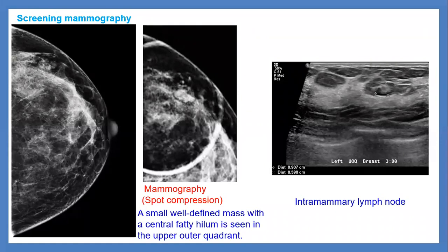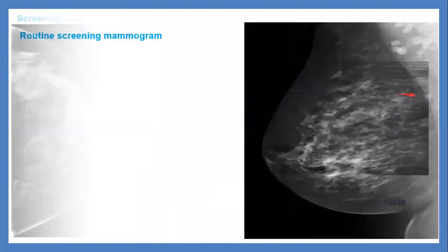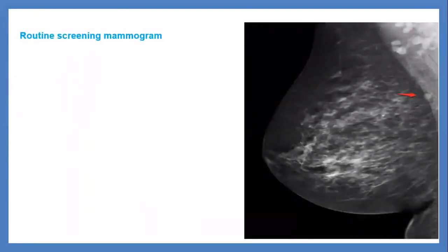What about the hilum? You said the hilum what? High echogenic. Yes, abundant fatty hilum with echogenicity equal to fibroglandular, which is very typical. It's okay. Yes. Continue for this case.